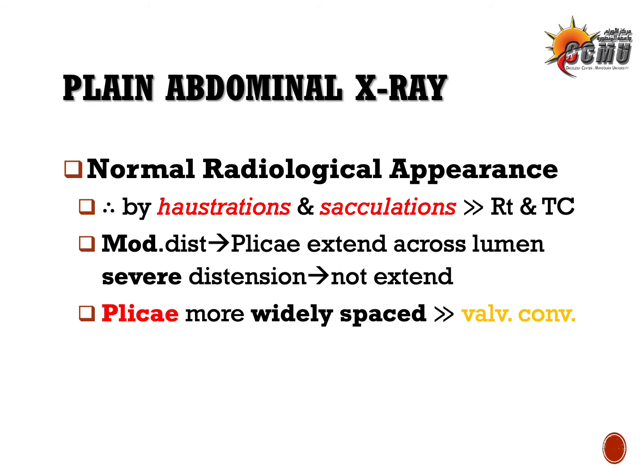And of course, compared to the small intestine, the plicae are actually more widely spaced than the valvulae conniventes of the small intestine. So if you see a structure within the X-ray film showing widely spaced plicae, then this is a large intestinal segment, not a small intestinal segment. As you've seen previously, the valvulae conniventes are less widely spaced; they are closely related to each other.